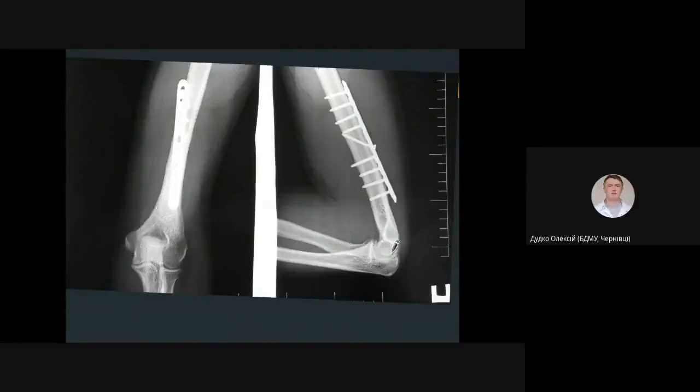We check the lateral view and we see that there is no dislocation or loss of congruity of the bone. But if we look here, we'll see that there's a shaft which is fixed with a metal device. This is a plate and screws, and we have additional screws that were inserted through the bone.